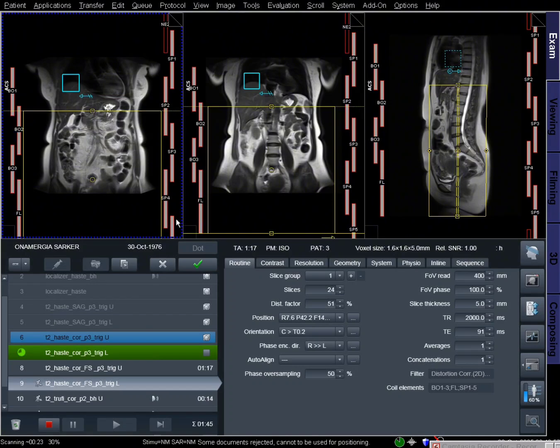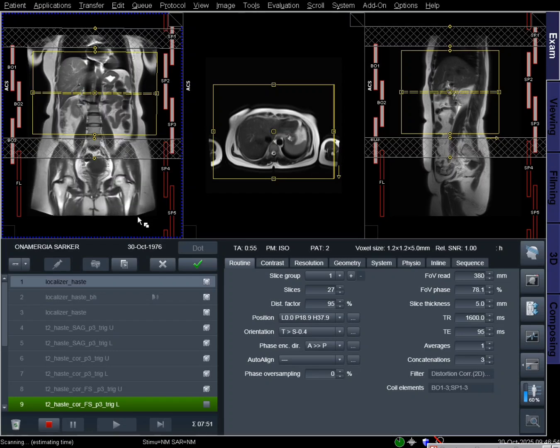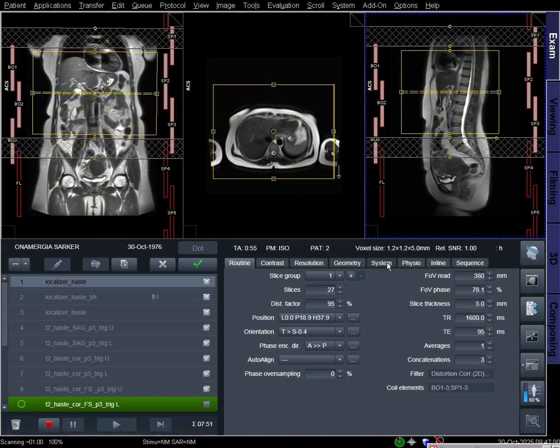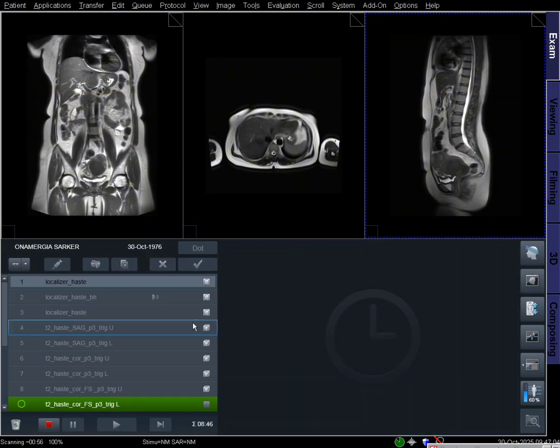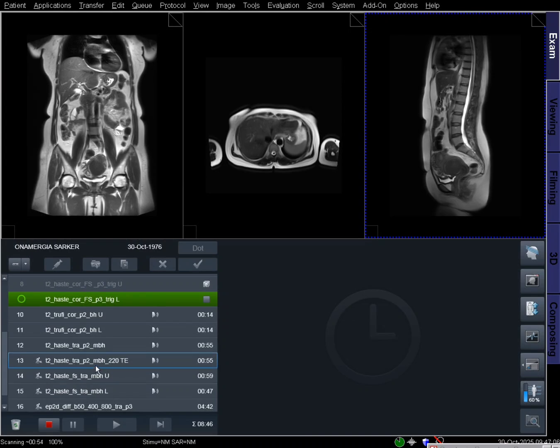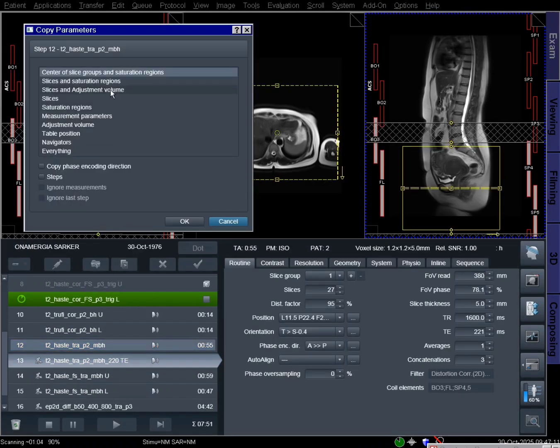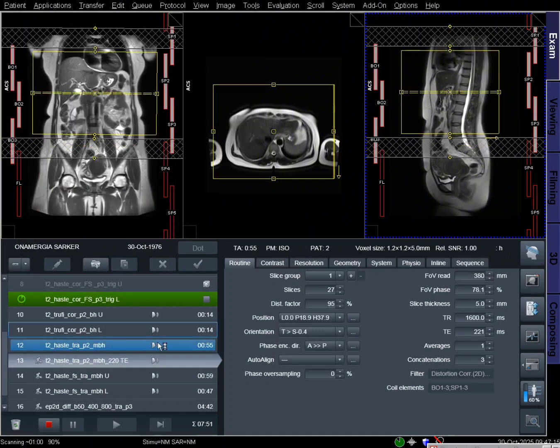Before the scan, all metallic objects must be removed as they can interfere with the magnetic field. For pregnant patients or those with renal impairment, proper precautions should be taken before administering contrast material. The final report provides detailed anatomical and pathological analysis of each abdominal organ, playing a vital role in accurate diagnosis and treatment planning.